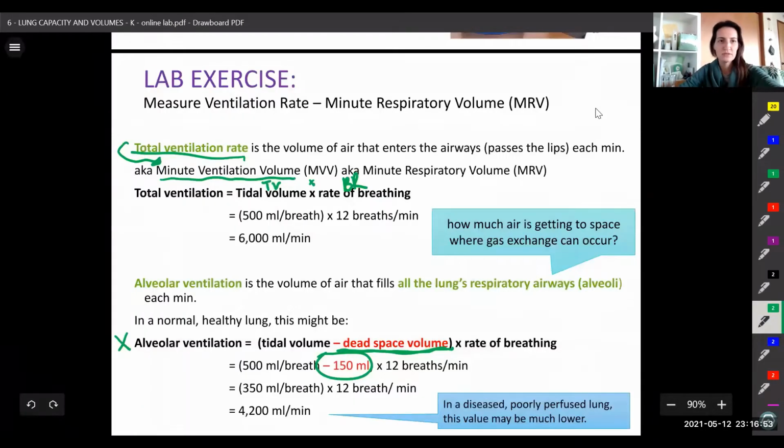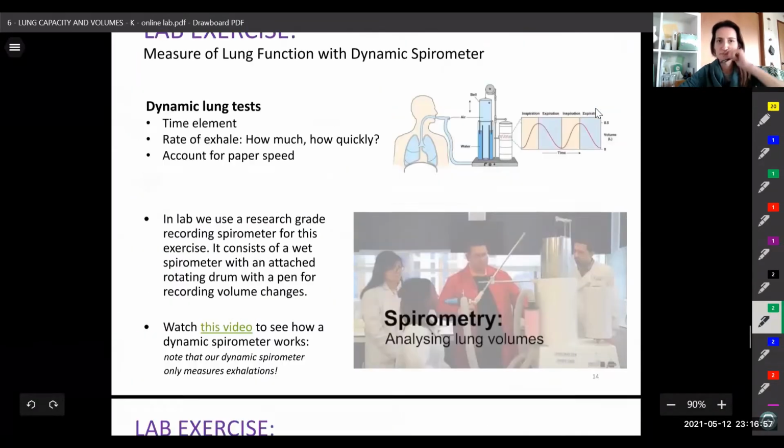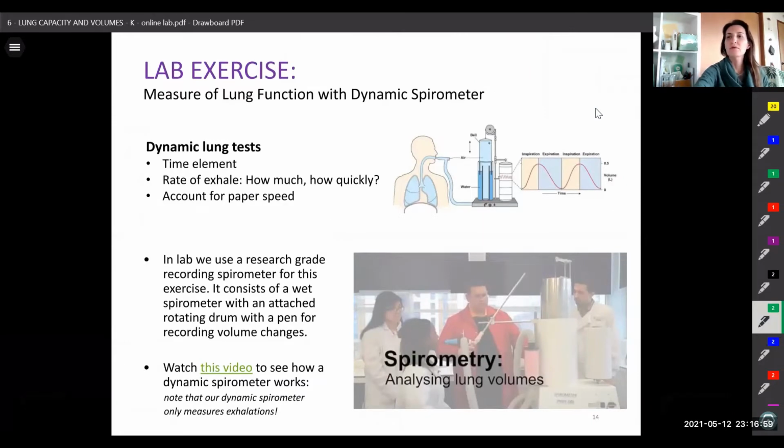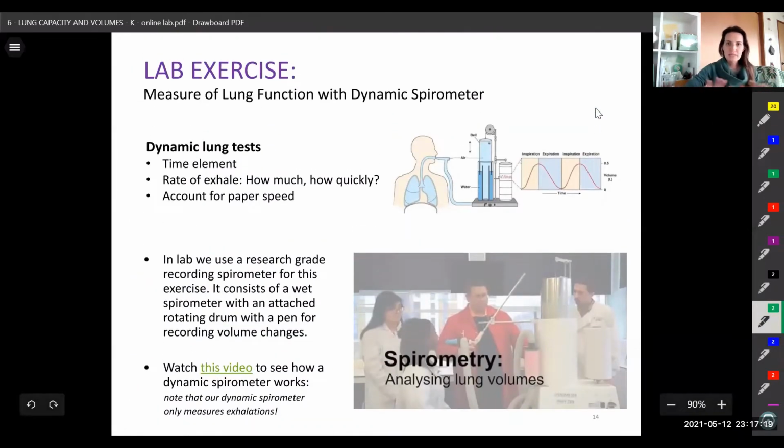Let's go back to this tutorial. And so we finished this section here. Now, the second part of this tutorial covers the dynamic spirometry measurements. And the specific dynamic spirometry measurement that we're calculating here is discussed on the next slide. That's called the FEV1 to FVC ratio. So let's just once again run through the dynamic spirometry setup here.